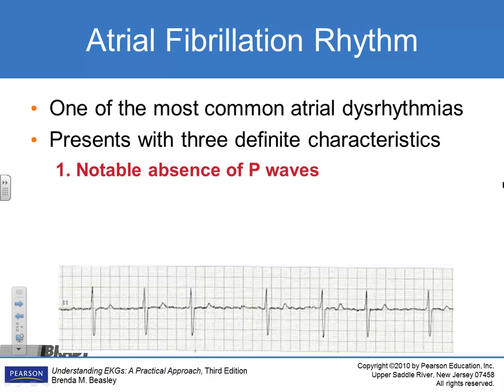So there's a notable absence of P waves. We don't see any P waves here. Some of these things, if you start to try to identify something, they're going to be F waves. Like if you looked at that, oh yeah, there's something there. They may be F waves.